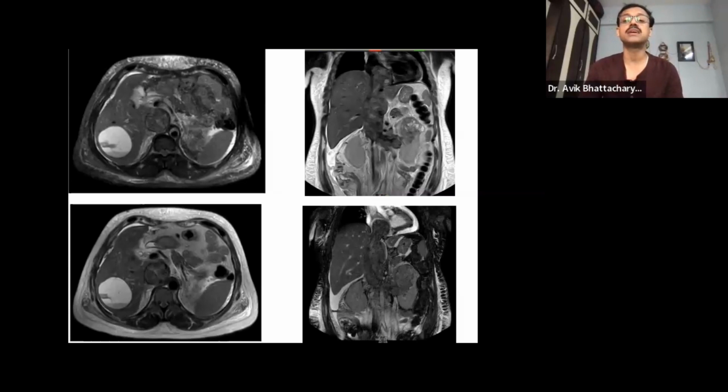However, this patient also has a mass lesion, which could be seen in the left lobe. You could see the left kidney. See the left kidney carefully. There is a mass lesion in the left kidney with a heterogeneous thrombus inside the left renal vein and inferior vena cava, going straight up to the right atrium.